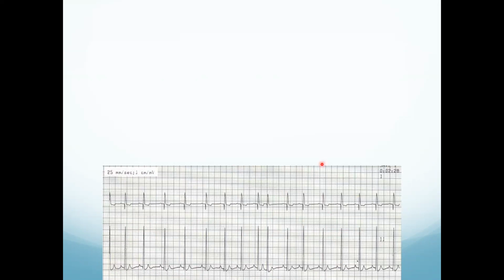So what do we think is going on here? Anybody want to give a guess in the chat? Okay, so sinus arrhythmia came up as a thought. Not an unreasonable thought. I think the problem here is that this is just too abrupt a change to be sinus arrhythmia. So sinus arrhythmia should be a very gradual change. It shouldn't be all of a sudden change and then go back to the normal rhythm.